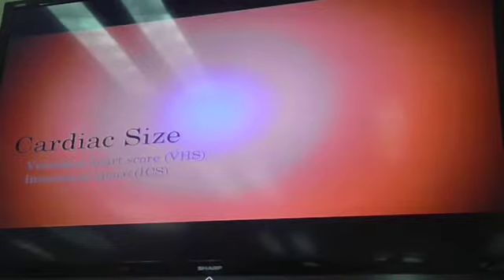So cardiac size, that's going to be the first thing for us to determine, do we have cardiac disease going on, okay? So the heart can be either what? Small, big, or just right. We got a Goldilocks here, okay? We're either going to be too small, too big, or just right.